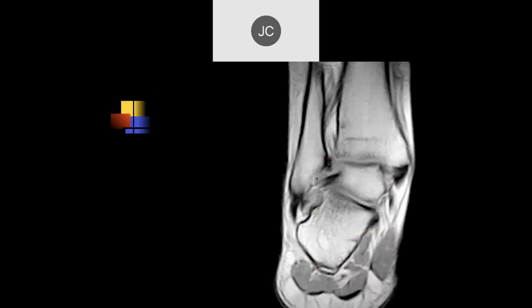Okay. Oleg, what do you think of this case? So, there's like edema in... Well, this is a T1 weighted image, so it really cannot be edema. I mean, it's a little darker, like darker bone marrow signal in the... You mean here? Subtalar. Yeah, over there.